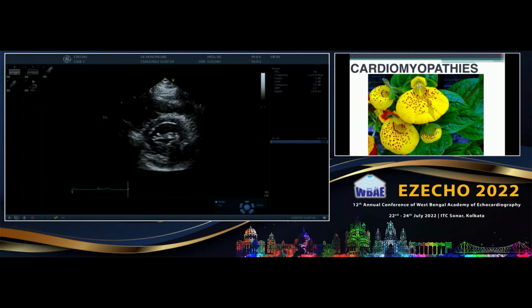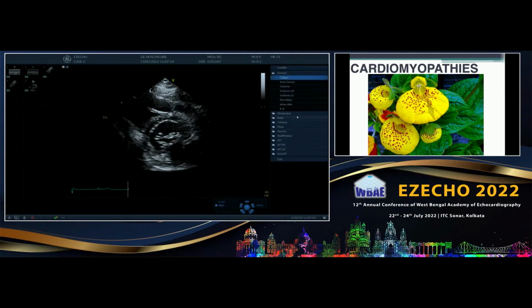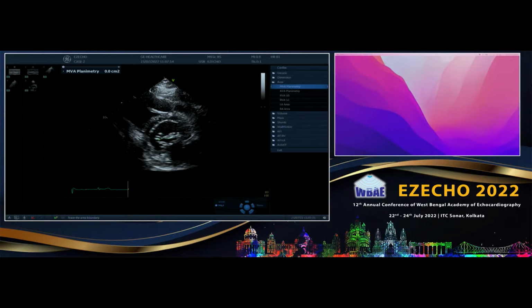And we see this also in patients with HFpEF after treadmill stress echo. At peak stress echo, after looking at the regional wall, we immediately scan the lungs. And you will be surprised to see some of these patients develop new signs of the comets.